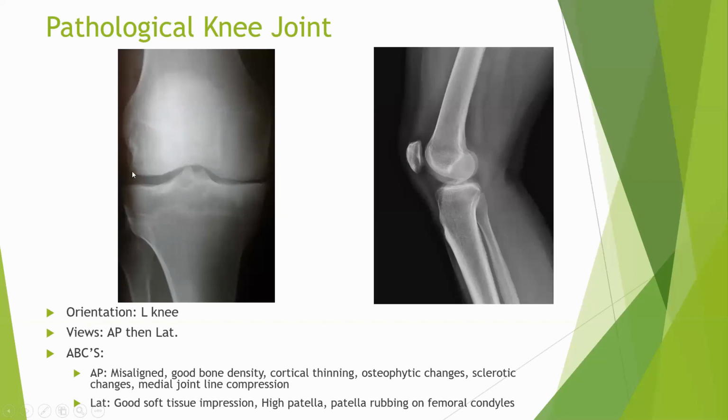Is it matching the femoral condyle lateral? Is it matching with the tibial condyle lateral? The femoral condyle in the medial aspect, is it matching to the medial aspect of the tibial condyle? Are these 2 points in the same line?